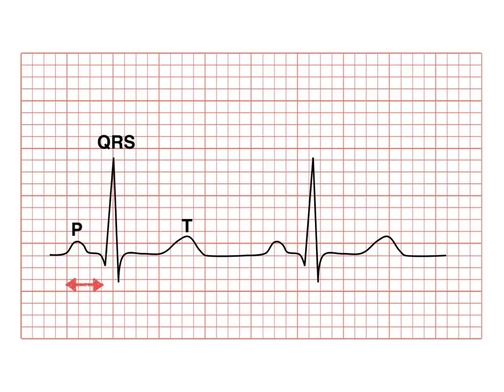You have a P wave, a QRS complex, and a T wave. What we're going to be concerning ourselves with today is really the PR interval. That is the distance from the beginning of the P wave to the beginning of the QRS. Now, normally, on a normal EKG in normal sinus rhythm, the PR interval is less than 200 milliseconds, which is 5 little boxes on an EKG. In this example of normal, it looks like we've got about maybe 3.5 to 4 boxes, so this is normal.